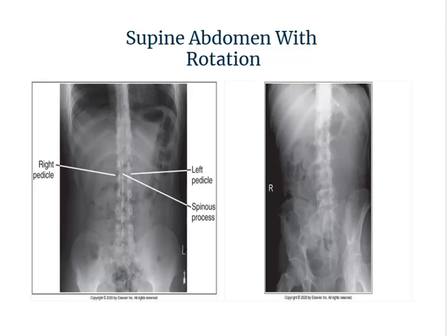Once that is indicated and you have identified that there is rotation, we should repeat the image to ensure that we get a true AP projection by moving the mid-coronal plane parallel with the IR.